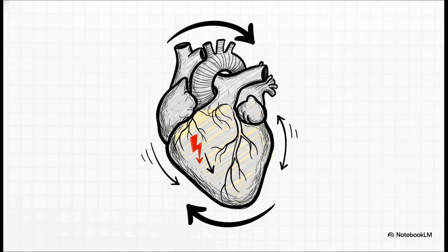For one, its longitudinal strain is actually greater than the LV's, and it's not uniform across the wall. And because that RV free wall is so thin and sometimes hard to see well, strain analysis becomes a fantastic tool for spotting ischemia. We also come back to this idea of rotation and twist. That ringing motion, with the top and bottom of the heart twisting in opposite directions, is just critical for an efficient pump. When you lose that twist, you know you're in trouble.